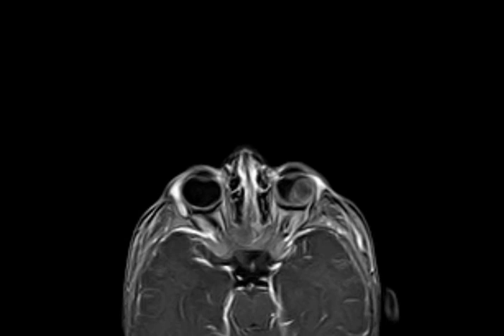What's your differential diagnosis for this case? I saw some signal void with the magnet, so I will put hemangioma. Hemangioma, okay. But there is no intense enhancement. Should be intensely enhanced, okay. What else? But most common in this age is hemangioma. Okay. Rehan, what do you think?